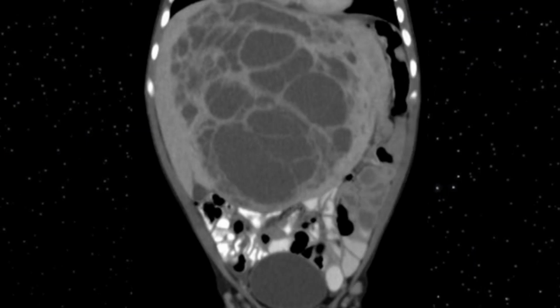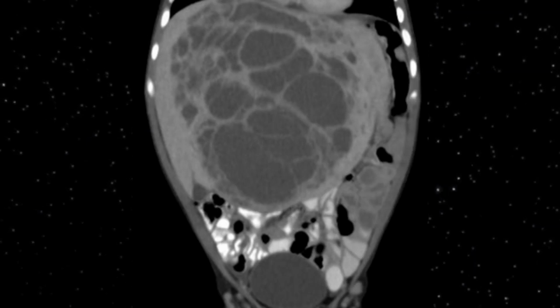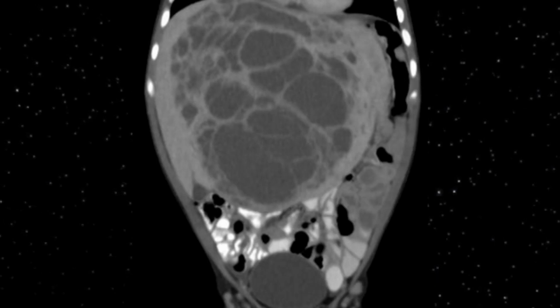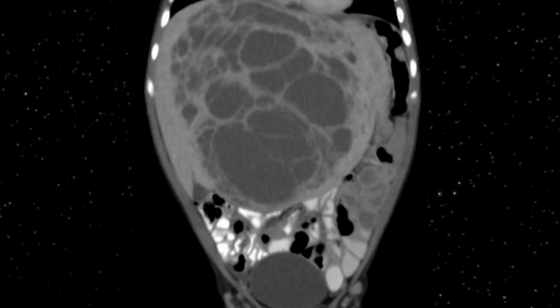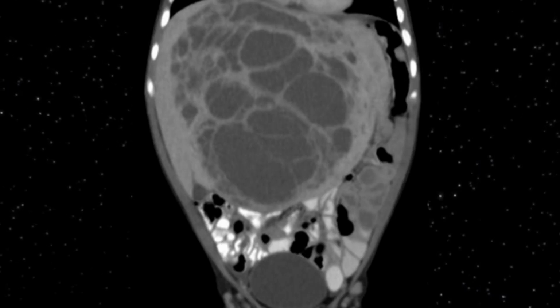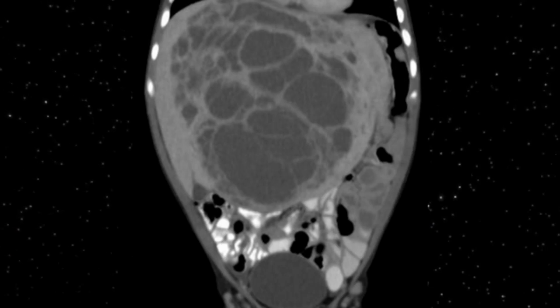So on that particular image slice you cannot appreciate the liver parenchyma quite confidently, but there are two things. One, the vessels are displaced. It is confirmed that it is not fed by the artery, as it is a benign lesion, so that's why it has no blood supply. It has only bile duct components and mesenchymal components, so that's why it is a mixture.